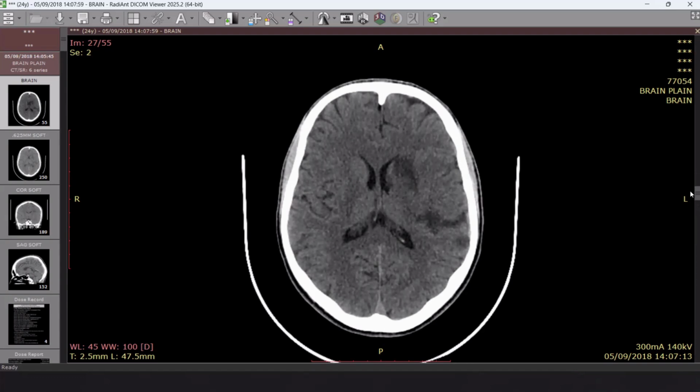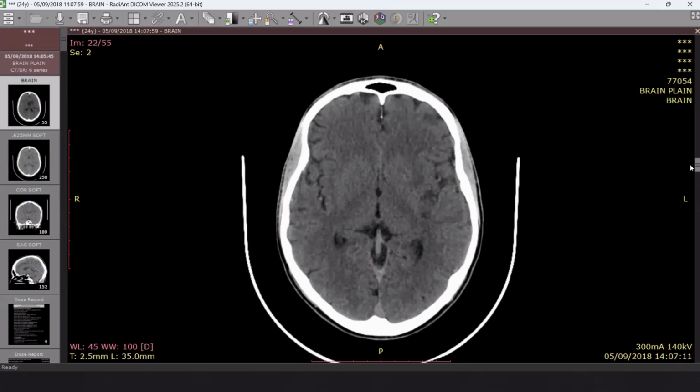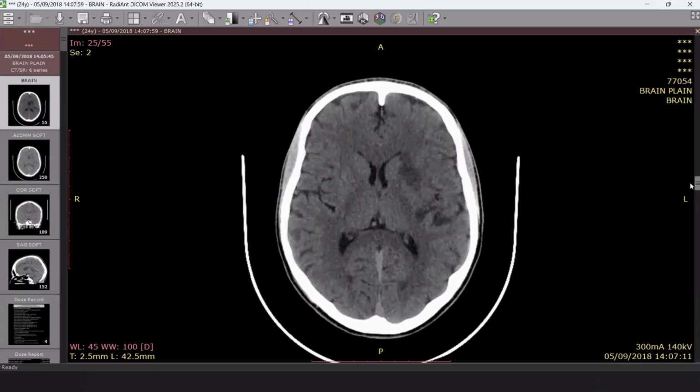Okay, before diffusion, we need to collect as much as we can from this. You are suspecting a stroke. You are suspecting infarction. Yes. What should you do?